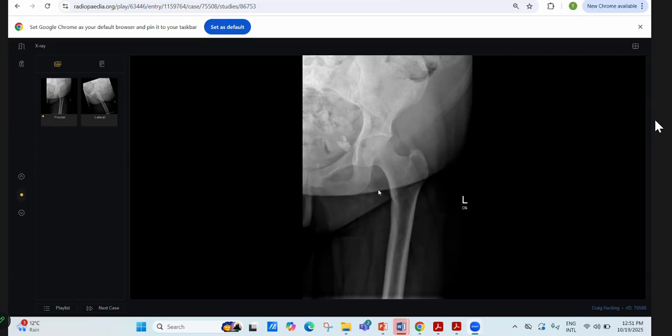Yes, ma'am. This is an X-ray frontal projection of a skeletally mature patient of a left hip joint, in which I can see that there is a narrowing of the joint space along the superior lateral margin of the hip joint, with mild marginal sclerosis. And there's widening of the joint space along the medial aspect. The contour of the femur appears to be normal, and I cannot see any other lesion in the head as well as the proximal visualized femur. There is an area of focal calcific density within the left hemipelvis.